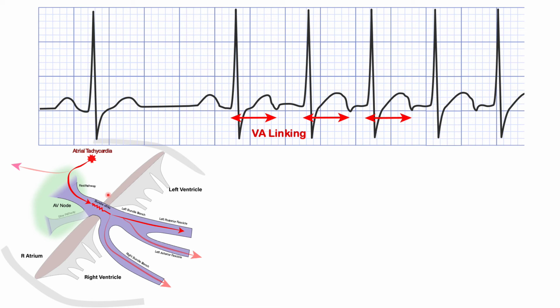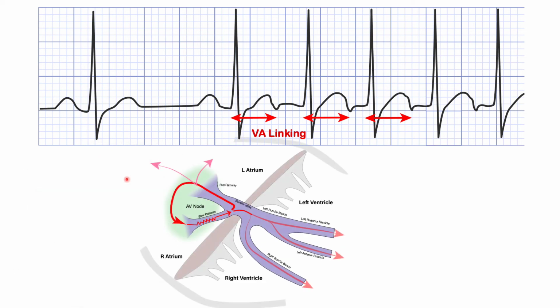This is especially helpful at the beginning of the SVT when there is a wobble in the tachycardia cycle length, which can be caused by the PR prolongation or simply a ramp up and ramp down phenomenon of an automatic atrial tachycardia. Now let's look at AVNRT. With each cycle of AVNRT, the slow pathway engages the fibers that lead directly to the ventricle and the atria. So the ventricles are linked to the atrial activation. So certainly AV node reentry is possible.